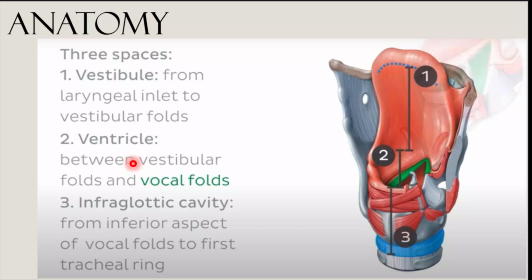Do not forget that. The laryngeal ventricle is a very important anatomical landmark, as it lies superior to the true vocal cords and separates the true vocal cords from the false vocal cords. This is a very important landmark to know, because if you find any abnormality, you need to know whether it is a supraglottic, glottic, or subglottic abnormality. How to do that? By identifying the laryngeal ventricles.